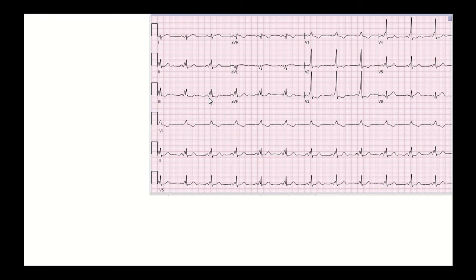Intervals. So our PR interval stands out as being relatively short. We don't see much of a baseline here. We see a PR gap there before the QRS starts. The QRS also appears to be wide, right? So here it starts on a big box, or ends on a big box, and if we go back, it looks like it's probably about 120 milliseconds wide.